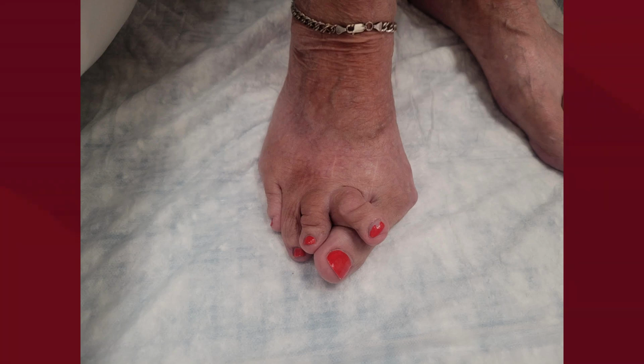So what's happened here is that there's been a plantar plate tear at the second MTP joint, usually on the lateral or fibular side of the plantar plate. And you can see that that has rotated and now we have a crossover of the second to the first toe. This can cause a host of issues, including pressure and ulcers from the crossover of the second to the first toe. And that's a serious consideration in our diabetic patient population.